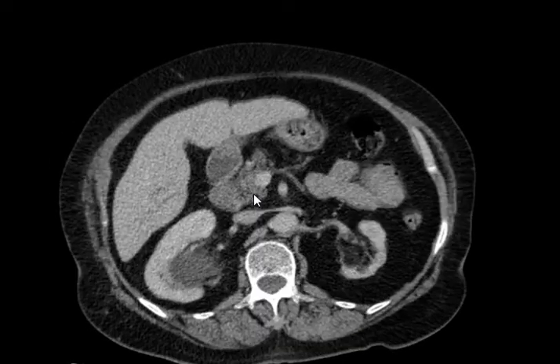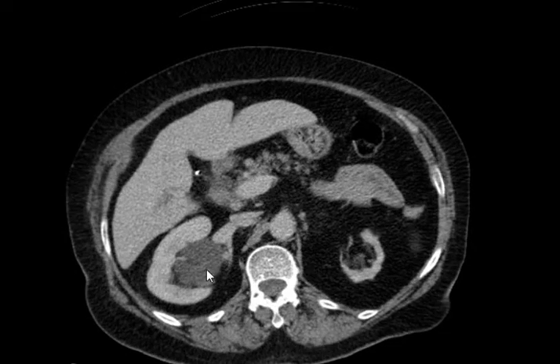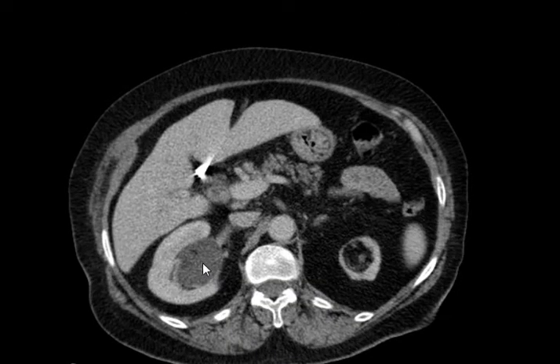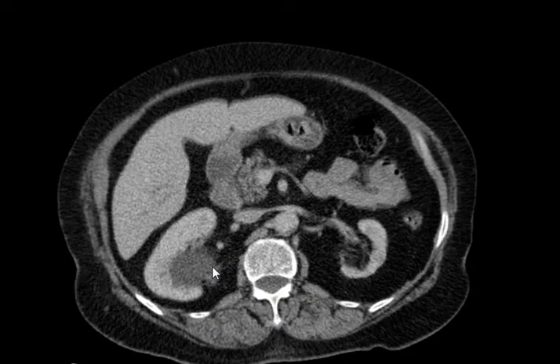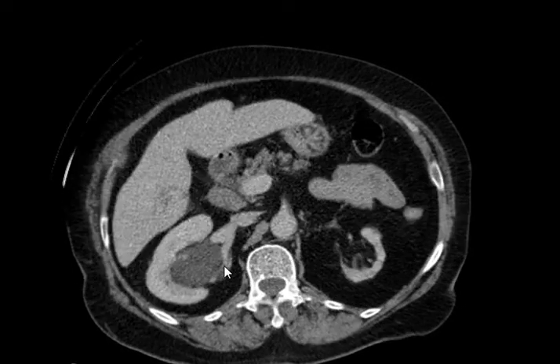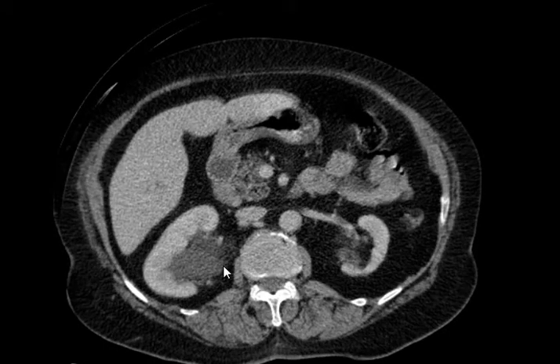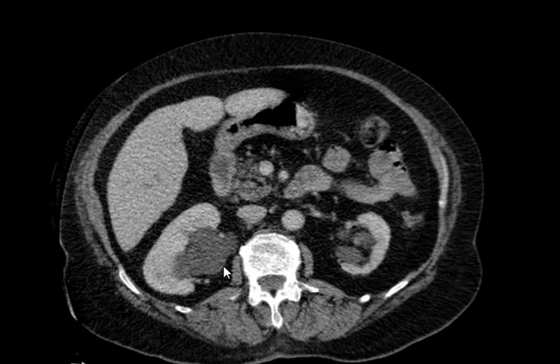What about the kidneys, right and left? Is there hydronephrosis of the right kidney? No. Whenever you see this appearance, it's just a few parapelvic cysts that simulate hydronephrosis. To confirm, just make a delayed image and you will see the contrast. So it's not hydronephrosis.